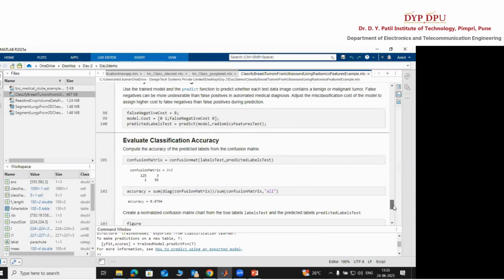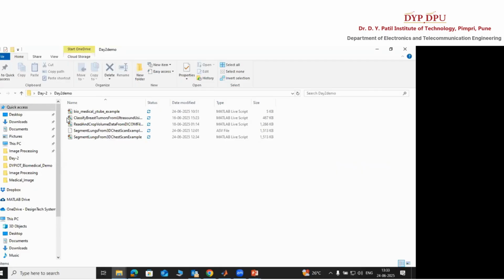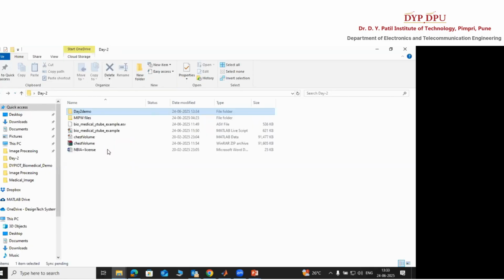It's a very simple thing. Whatever features we extracted, we can label them with a percentage of confidence very easily. Yes, it can be displayed. I will go through one example.